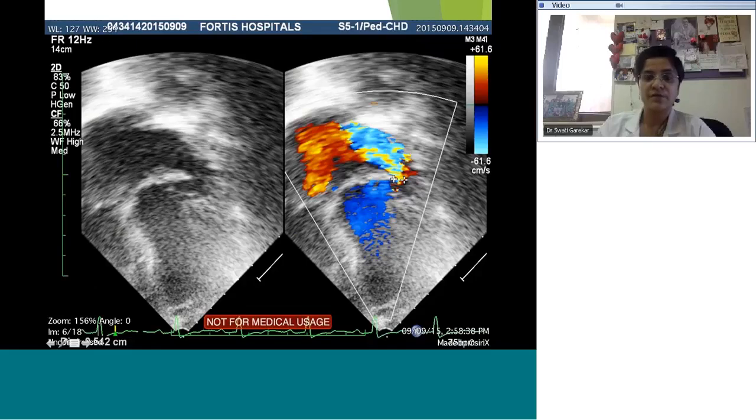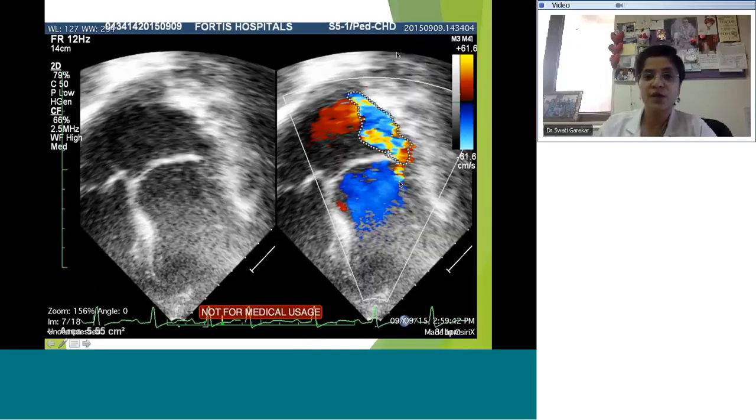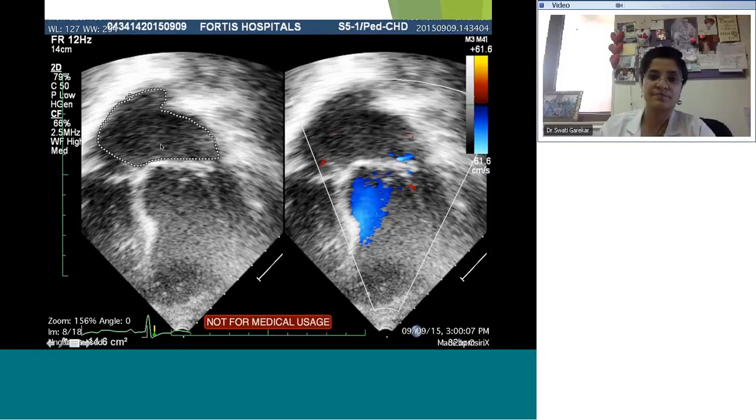of mitral regurgitation. And things are quantified into mild, moderate, or severe regurgitation dependent on the diameter of the vena contracta. But that's not the only thing. You can look at the area of the MR with respect to the area of the left atrium. So these are all very, very well standardized.